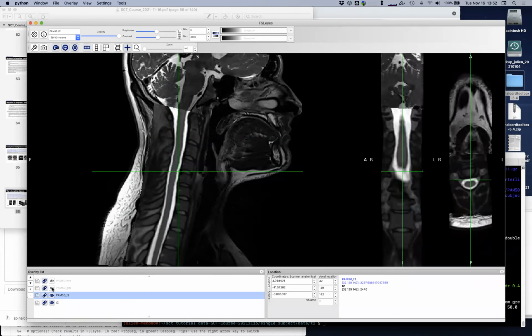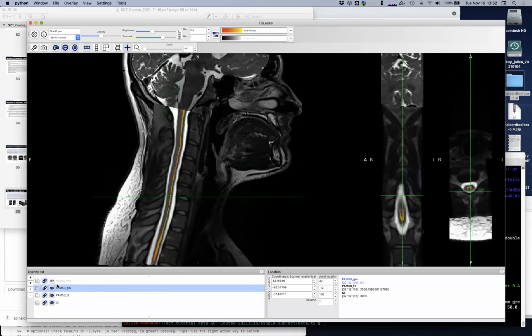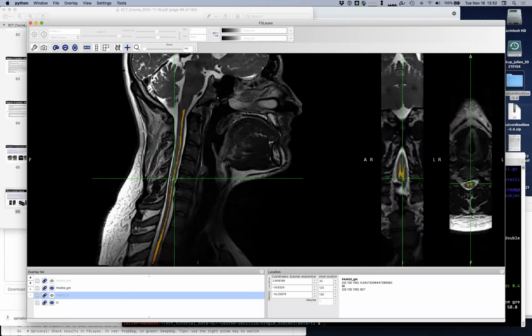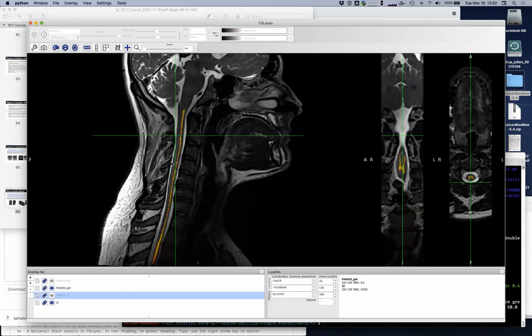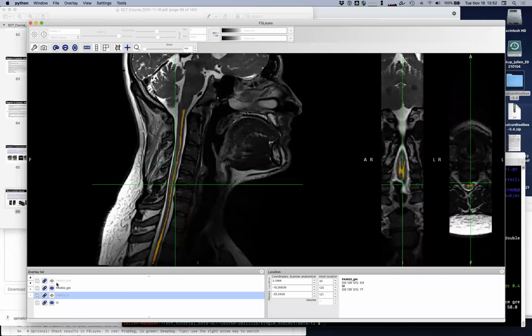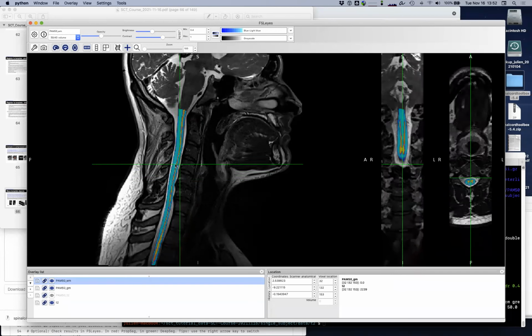And we can also add the gray matter atlas. So that's the gray matter. Again, it's only warped from the probabilistic template, right? We have not segmented the gray matter here because we don't see it on this contrast. And we can do the same with the white matter.